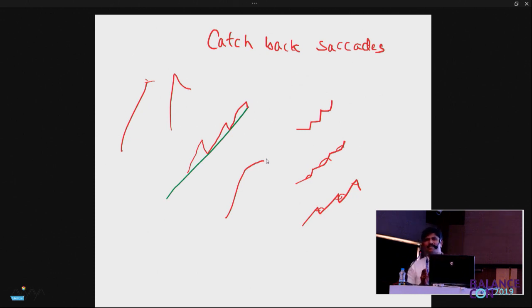We compared the slow phase with two things. What are those two things? The slow phase with either not at all having a slow movement, where pursuit of the slow moving target is completely done using saccades, small jerks, which is the saccadic pursuit.